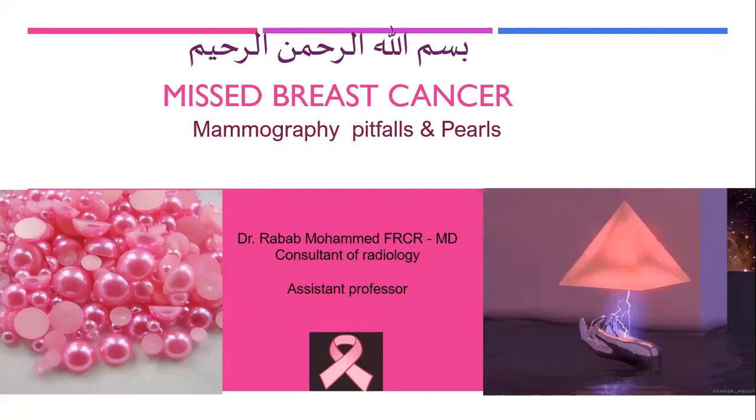Our talk today is Missed Breast Cancer, Mammography, Pitfalls and Pearls. Can you tell me the difference between these two images? Any volunteer to show me what is different in these two images?